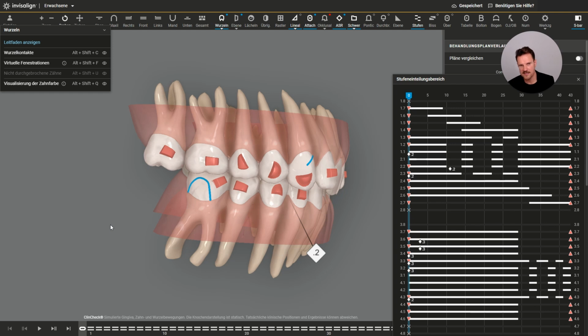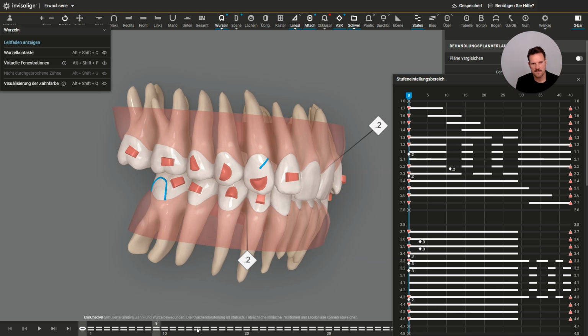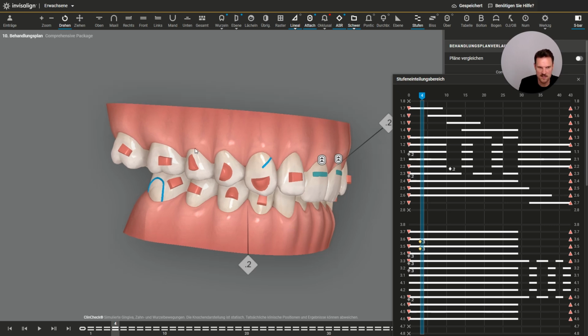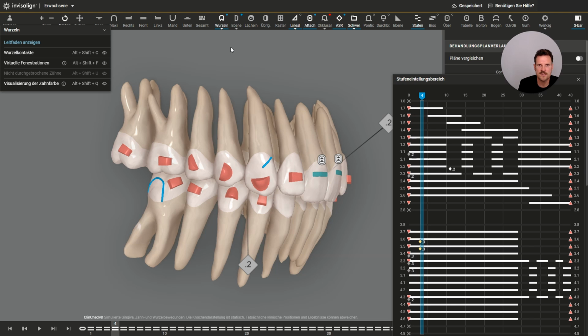Yeah, here you can see an Invisalign case. And for Invisalign, it's a little bit different. So here you can see a very nice simulation of the gingiva, but you can have different simulations. Of course, this is the classical ClinCheck that you know without CBCT integration. And this is exactly the trim line. And for Invisalign, the trim line is always 100% exactly what you can see here. You can have different views, and here you can also see exactly in this area you will find the trim line.